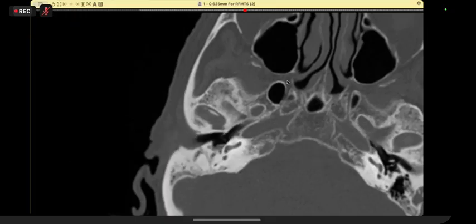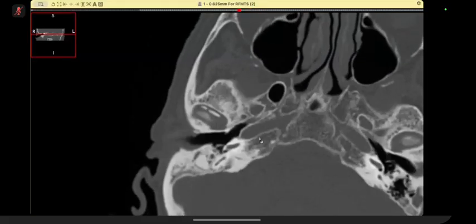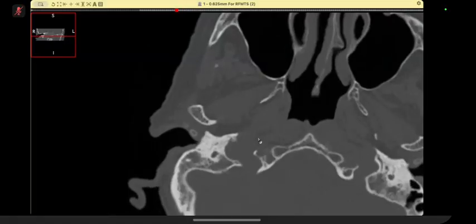Okay. Now concentrate on the right temporal bone. And I warn you, there is a bit of fine touch in this case. So everybody, please see it very carefully. It's a good one. Till now, I have shown you slightly simple cases. This one requires a bit of anatomy. So this is an 84-year-old, right-sided chronic mastoiditis. Rule out a cholesteatoma. This is what they have written.